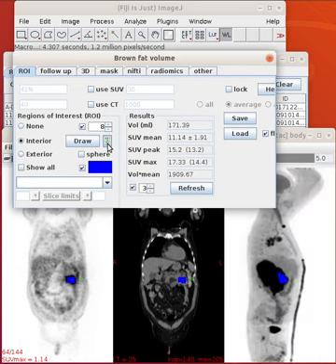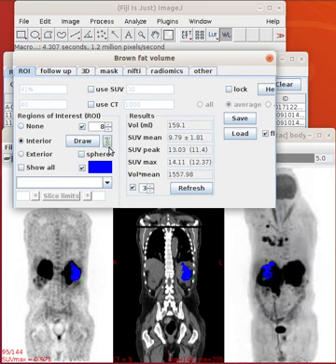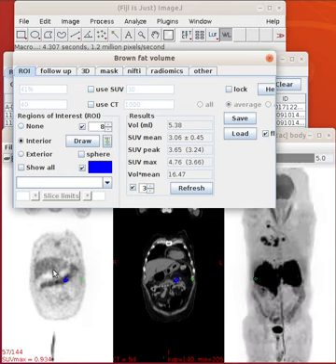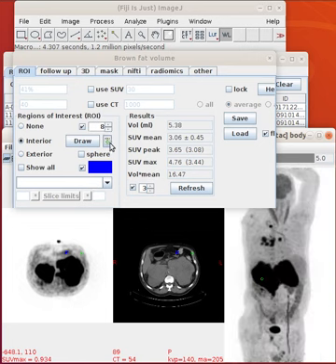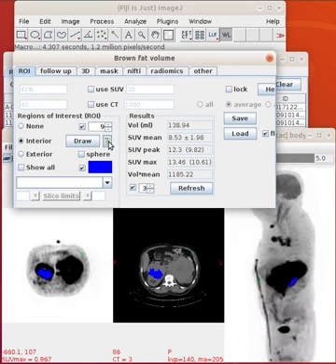Delete. This is clearly there. Delete. Delete. Delete. This you can see is below. Let me look at here. And here it's obviously not in the right place. Delete it. No, I'll leave it. It's not part of either one. This I'll delete.